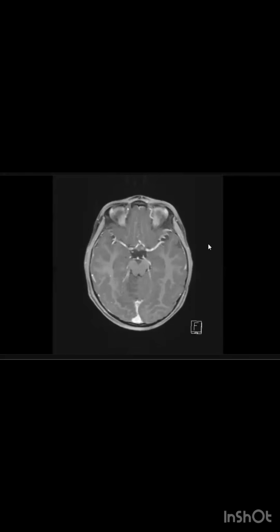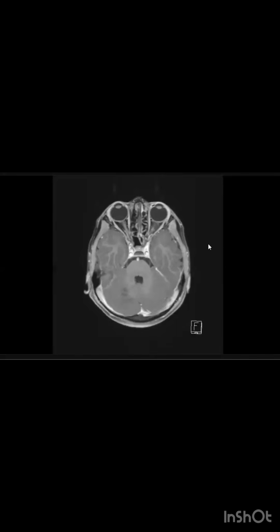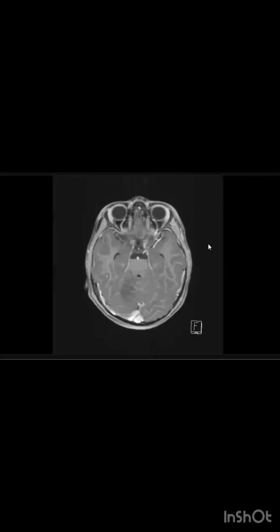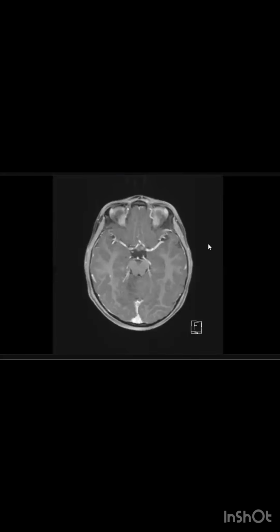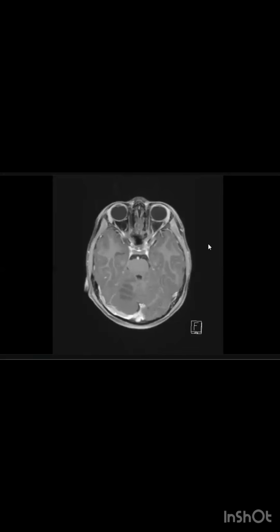No, I didn't. The patient has been off legs for the last 24 hours. You will judge the patient by two sequences only, T2 and this contrast? No, can I look for the diffusion? What are you suspecting? Maybe infarction.